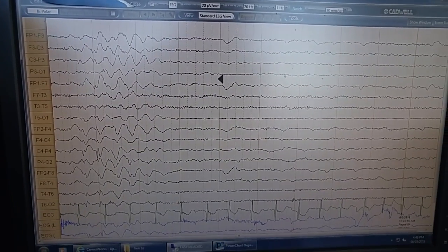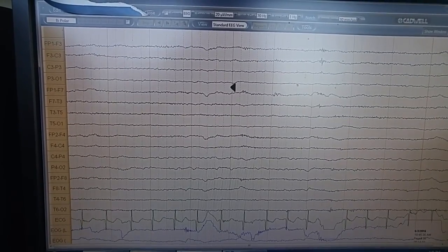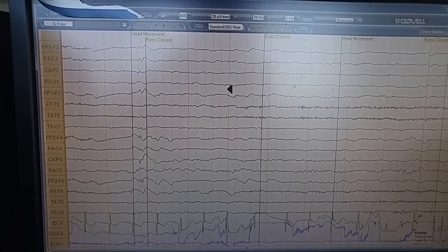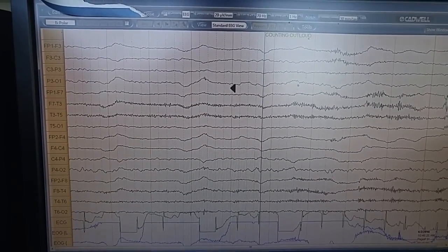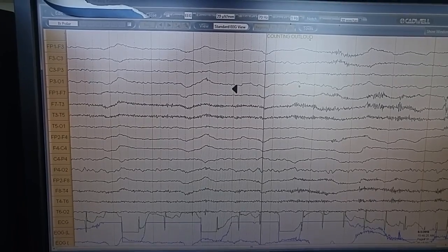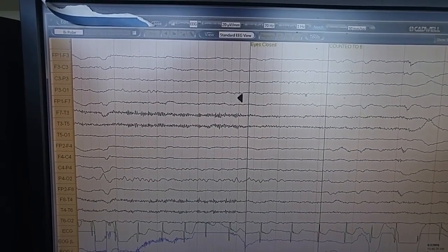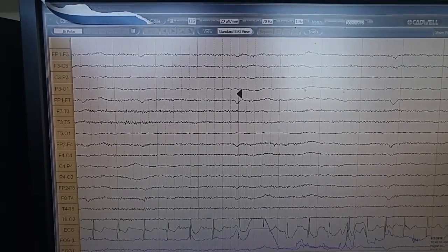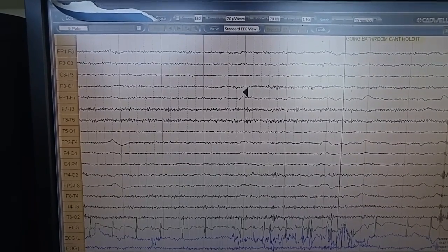This is what you will have with patients with generalized epilepsies, such as absence. It makes sense clinically too, where they go from these staring spells right back to their baseline. There's no postictal period, which you would expect with partial epilepsy if it were to have a partial onset and then affect, of course, complex partial if it affects your consciousness.